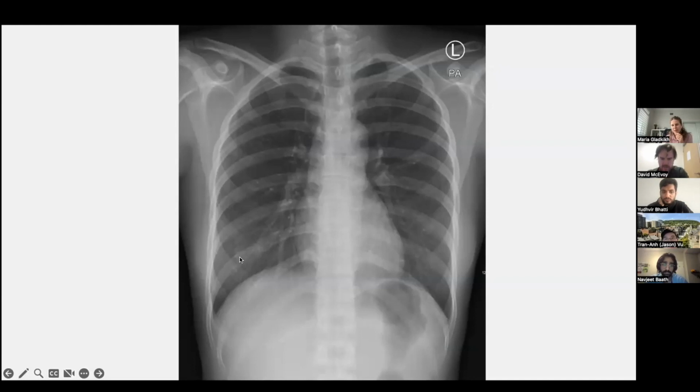This ended up being a patient's nipple. So just keep that in mind, something that looks well circumscribed, especially if it's bilateral, is probably a patient's nipple. I've had a case like that where I thought it was a lesion, but it was just a nipple. So that being said, the point of all of this is just to be able to localize.